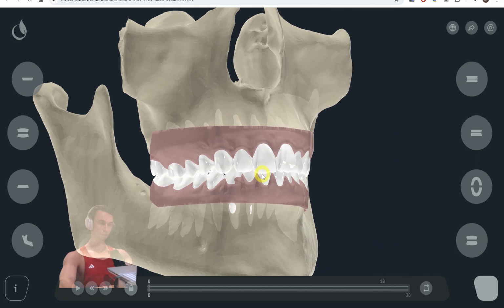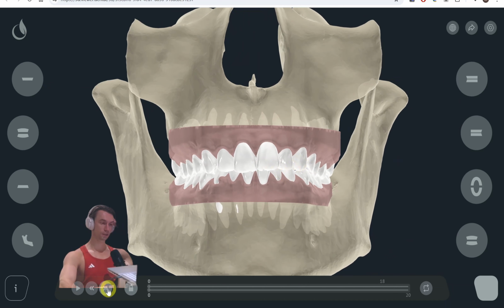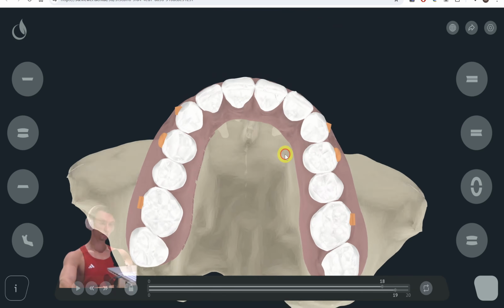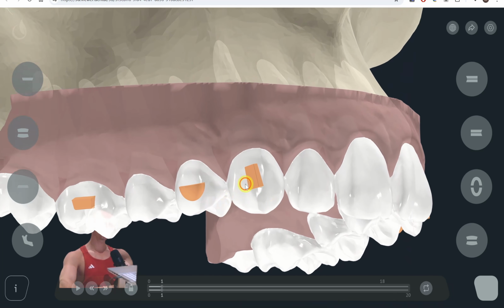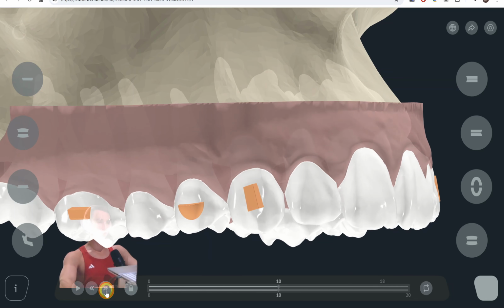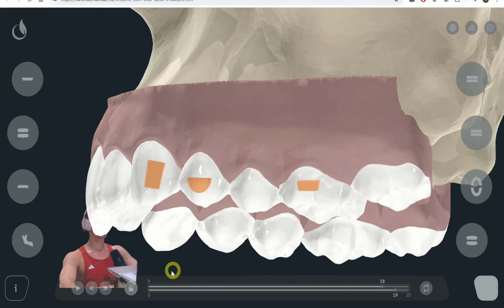You can open it and put your logo, your colors, your design; it's customizable. And then you get this animation and show it to your clients. Look here at this setup, I also increased the attachment. It's getting bigger and bigger to fight the accumulation of the errors, to reduce the refinements.